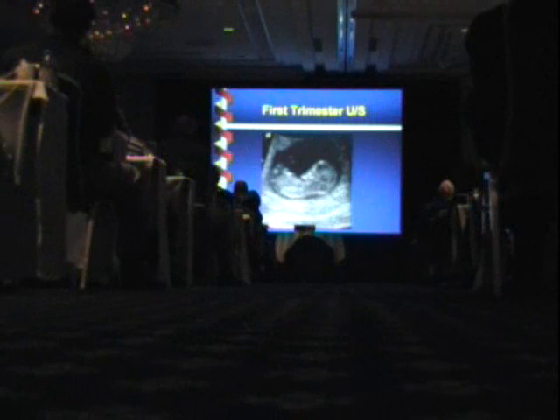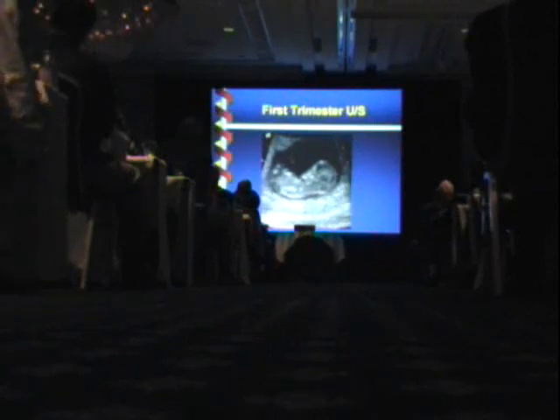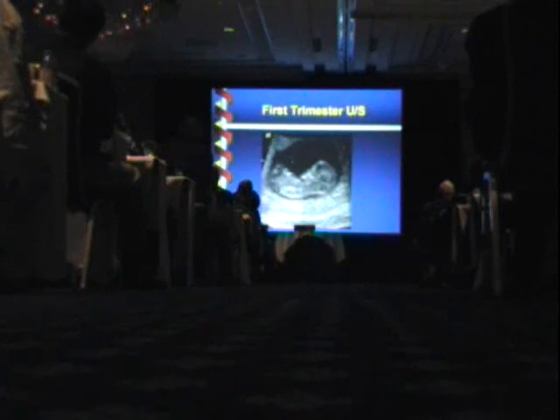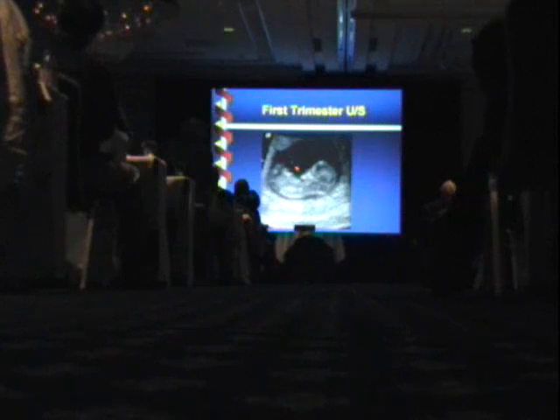So this is a little eye test, and I'm going to come back to this at my very last slide. Here is what looks like a cute 12-week ultrasound. Let's say the woman came in for bleeding. So look at it for a few seconds, and I'm going to tell you that this baby has something very abnormal with it, but I'm not going to tell you what it is until my end slide. Cute little 12-week fetus. There's a nice heartbeat at a normal rate. There's fetal face and body. Just look at it for a second.